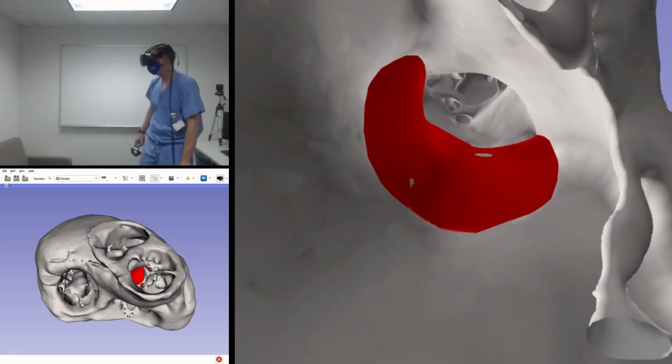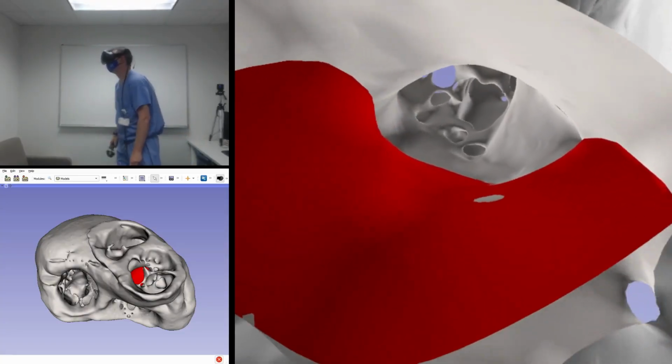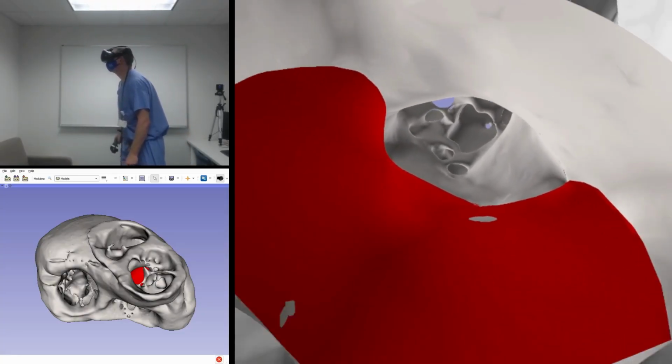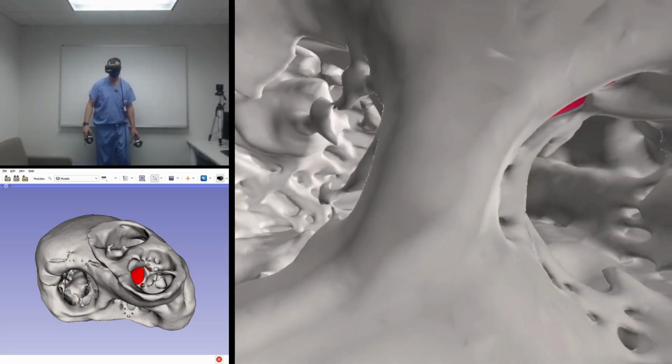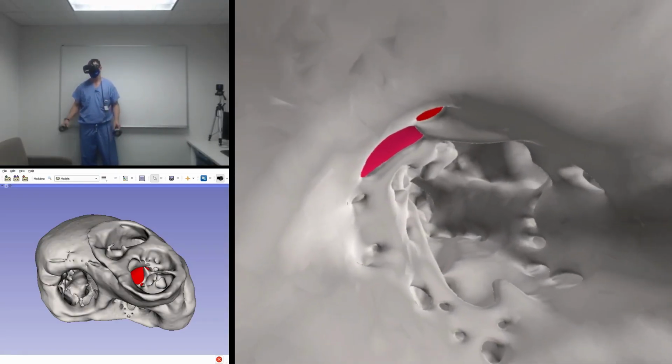Validating initial surgical concern, the LVOT appears to be narrowed in the region of the conus, prompting discussion of whether some of the structure can be resected or whether the VSD could be safely enlarged.